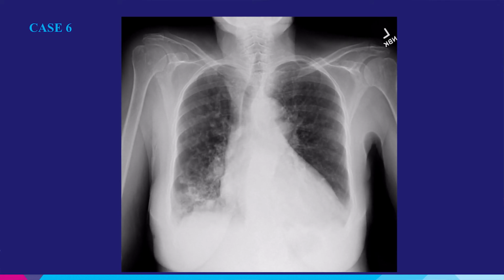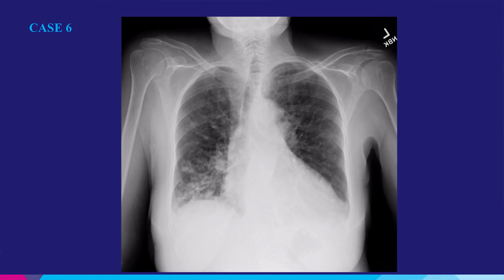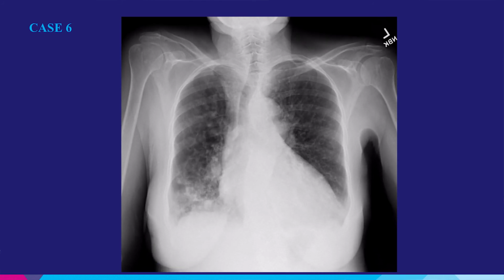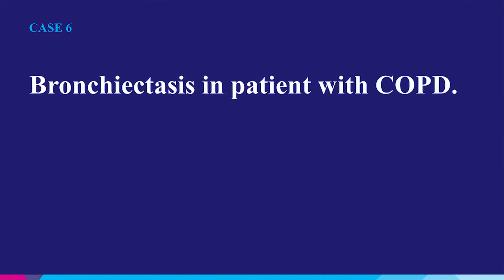So there are several diagnoses you make with this dynamic X-ray that you could not make with a static X-ray. Those are the opacities here, impacted bronchi, COPD, and all these findings that you could more definitively diagnose with basically the added value of dynamic imaging as opposed to static imaging.